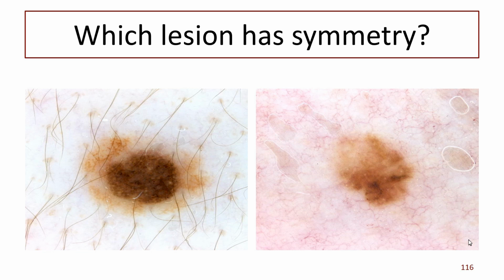And that doesn't mean it's not symmetrical, really, because this is biology, not mathematics. So we have one structure in the middle and another structure round the edge. And it's deliberate, of course, to put this one in here, hoping that Mystery would absolutely tell us exactly what she did. Clinically, how we know it has lost bits rather than bits are growing off it?